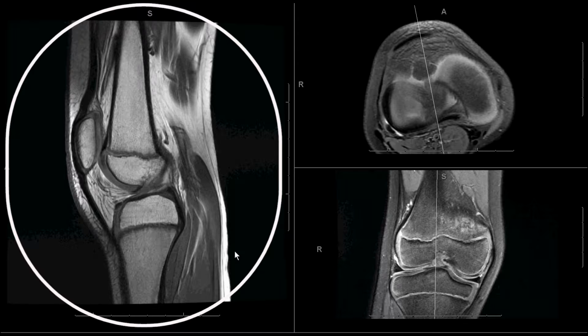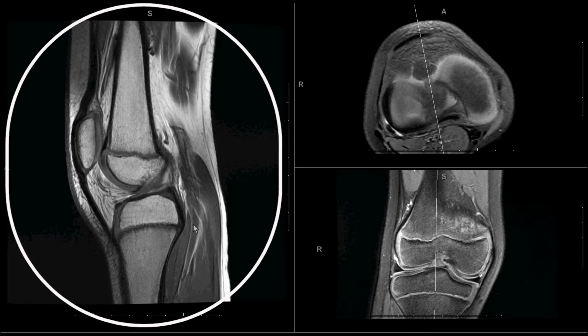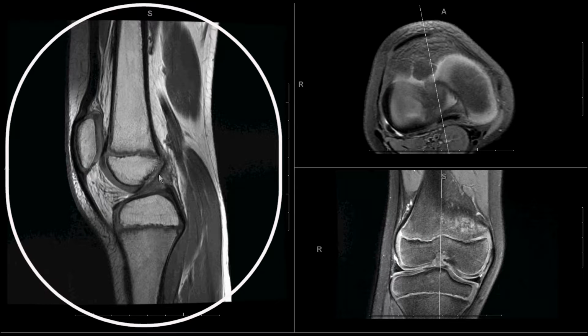So what are we going to look for in the ACL? First of all, let's look at the normal anatomy. This is a normal case, and we are at midline here. Look at the comparison axial and coronal. And we can see here that the ACL is going to be this structure here that's sitting and flanking this posterior line along the posterior femur. And we can see that it's got dark signal intensity, it's got some intermediate signal intensity along the posterior fibers, and it courses from the anterior tibial spine up into the posterior aspect of the femur in the intercondylar notch.